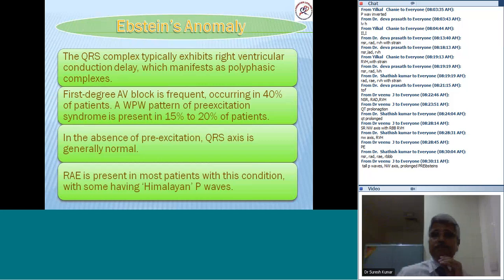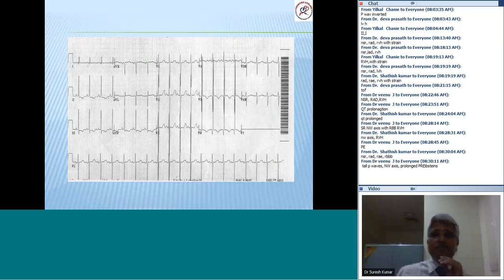Now let's see this. Let me have a diagnosis for this.